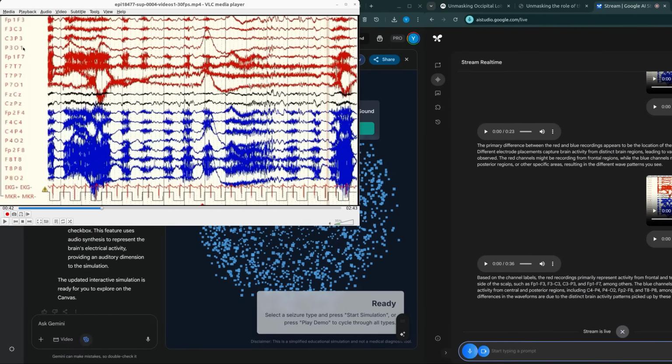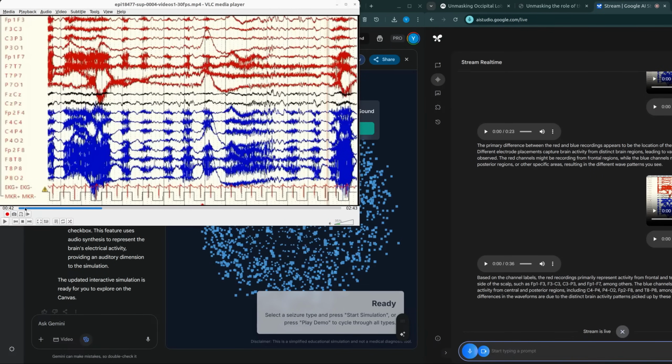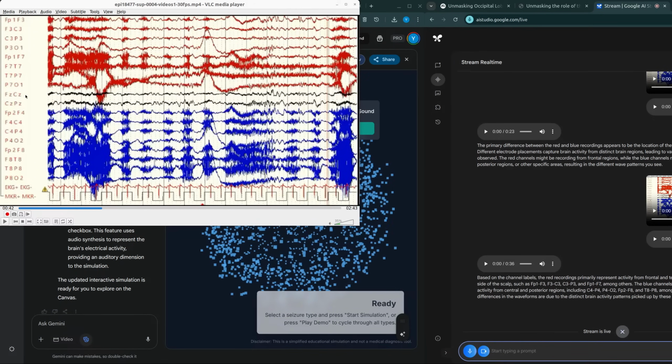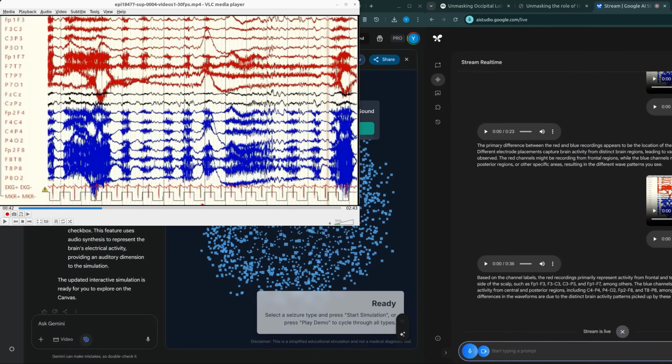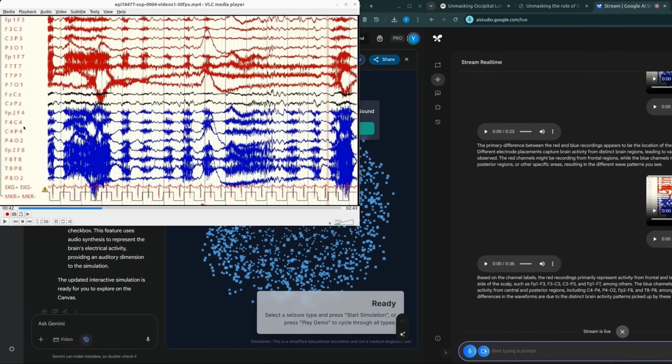Okay, that's very nice. Again, looking at the labels of each channel, what's the current montage that is being used? Can you explain what it is and just make a guess which montage is being used?